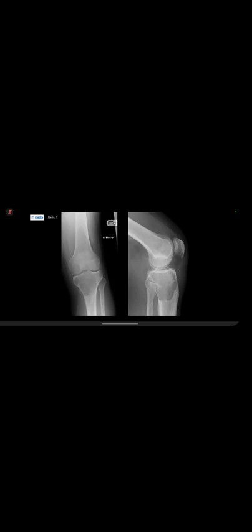Okay. However, comparing the medial aspect of the lesion of the cortex to the lateral cortex of the tibia, I think there is some thinning of the cortices in the medial aspect compared to the lateral aspect. So do you think this is aggressive or non-aggressive? For this affection of the medial cortex, I think I'm going with an aggressive bony lesion. I'm sorry, you cut out. Aggressive or non-aggressive? Aggressive. I think we will go with aggressive.